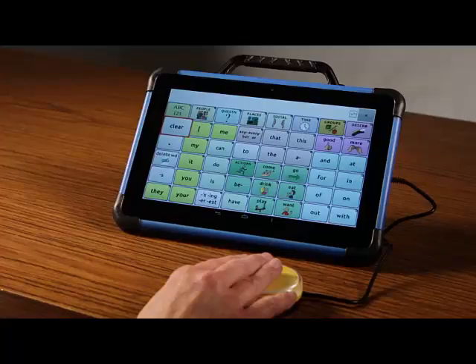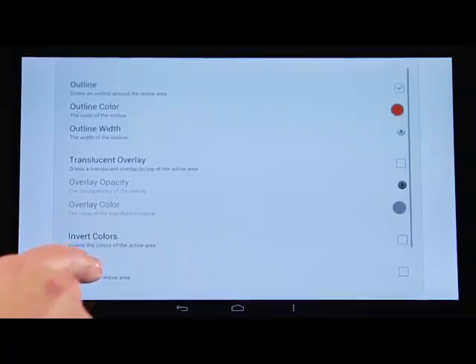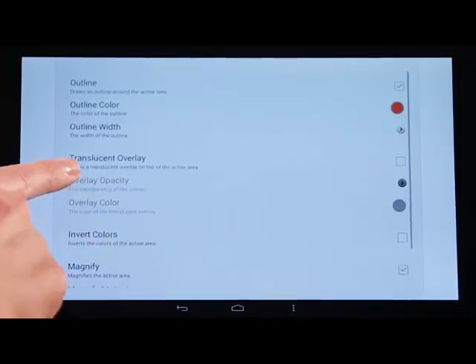This example will be with Word Power 48 and a row column pattern and adjusting the magnification to 120%.